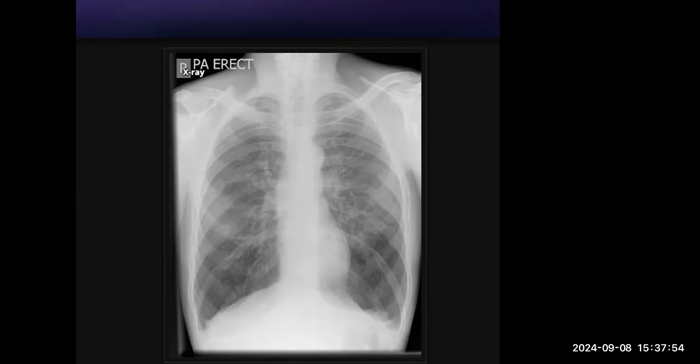I would also think of tuberculosis. There is no evidence of bronchiectasis as well. I would like to proceed with the HRCT for this patient. Anything else that you see classically abnormal in this X-ray, or anything abnormal apart from all the findings that you described?